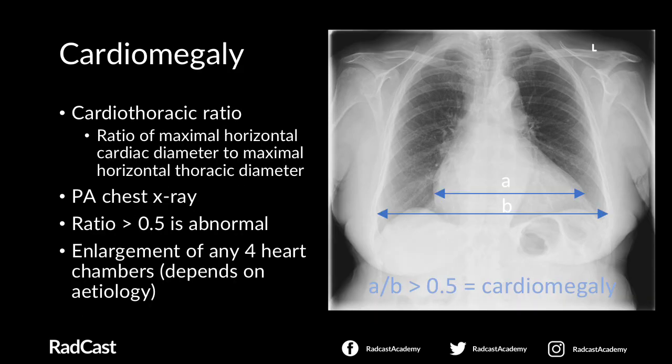So as the heart remodels secondary to heart failure, it can enlarge or dilate as it struggles to accommodate the venous return and the pump function worsens still in a vicious cycle. This cardiomegaly, or heart enlargement, can be visualised on a chest x-ray, and it's more likely to be seen in a patient with quite established heart failure.